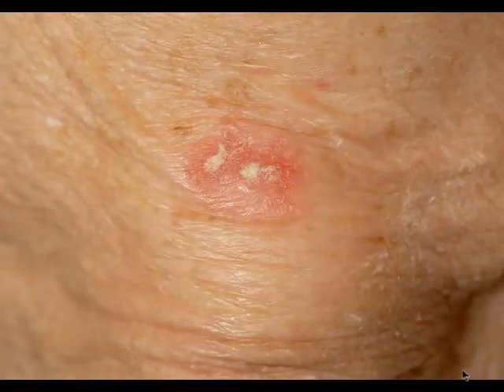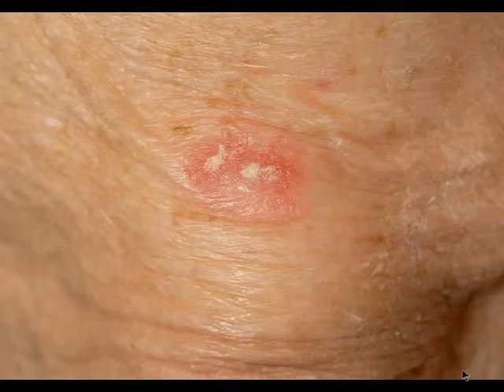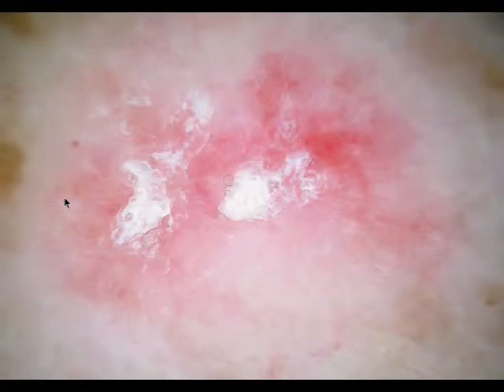The clinical first. It's a clinical image of an unpigmented, slightly elevated plaque. It's scaling, and here's the dermatoscopy. What type of vessels do you see? Well, you see only one type, and these vessels are dots. Here, here, here, here, dotted vessels. So this is a monomorphous vascular pattern that consists of vessels as dots only. How are they arranged? Well, the arrangement is non-specific. They are all over the place.